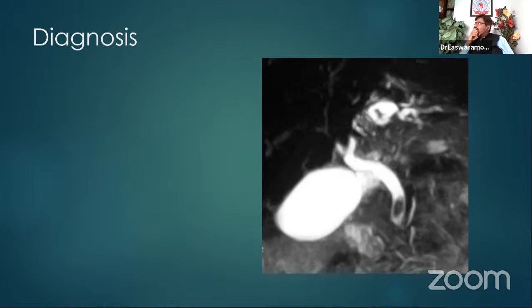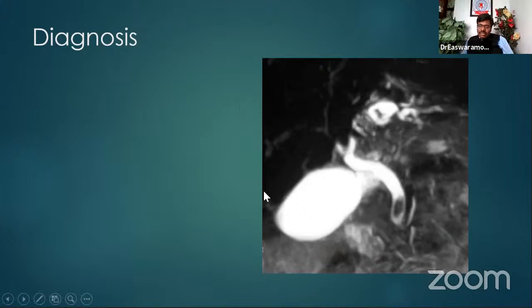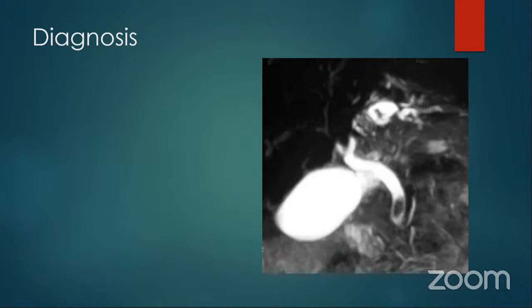Bharat. Sir, contrast of the biliary tract, sir, showing obstruction of the bile duct. Yeah, this is a contrast in the biliary tract, that is called cholangiogram. What type of cholangiogram? You have T-tube cholangiogram, intraoperative cholangiogram, MR cholangiogram, CT cholangiogram, and you also have ERCP cholangiogram. Which one is this one? Sir, ERCP, I guess, sir.